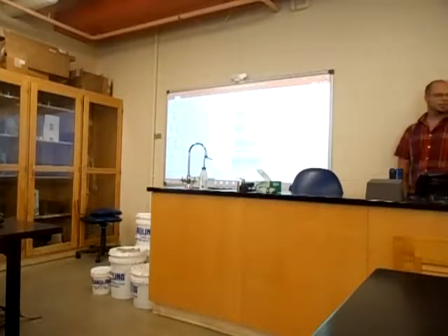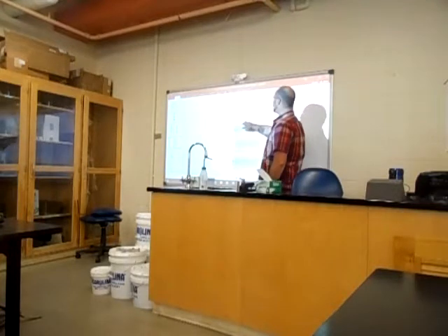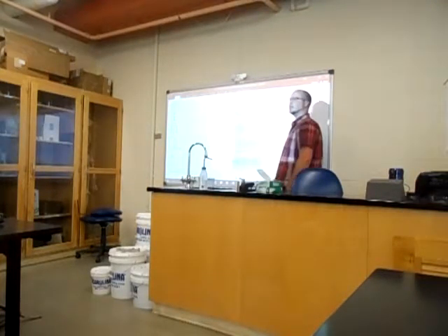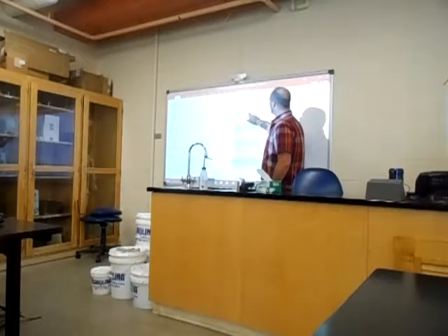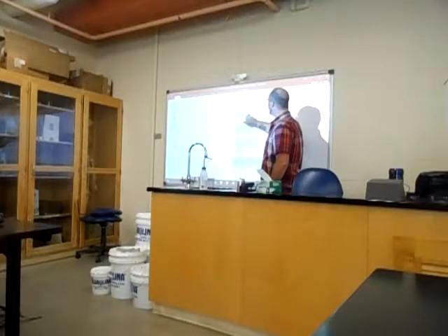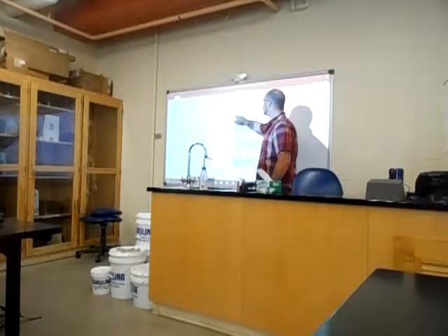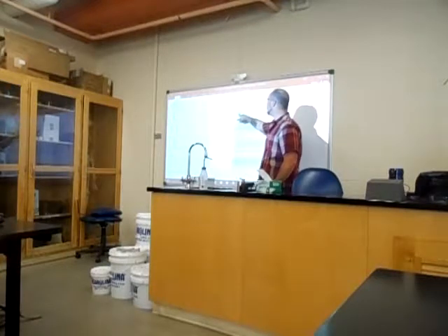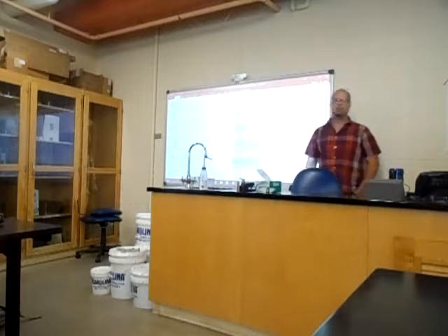So here we've got some ECG readings. The one up here at the top says sinus rhythm. So what does that mean? Normal. And if you go through and look, each spike is a QRS complex. And you see on either side of each one a P wave and a T wave. So for every contraction: P, QRS complex, T. P, QRS, T. And it repeats like that at steady, predictable intervals.